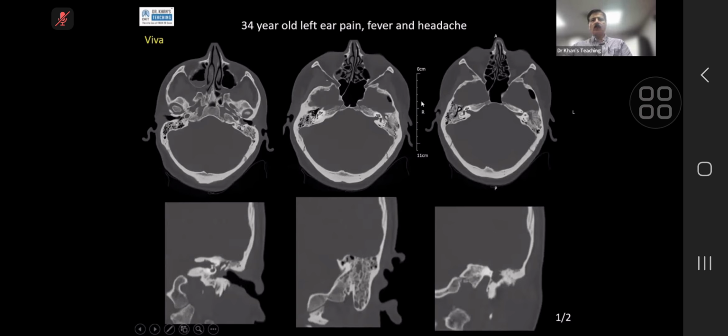You picked up the locule of gas very well. This clinical is very revealing, but the key finding is that there is something acute inflammation happening, and even here there appears to be bony erosion. And this is coronal, so this is tegmen tympani. This is what we call tegmen mastoideum, which is superior to the level of the mastoid. There is a dehiscence here. This means there is acute bony destruction.